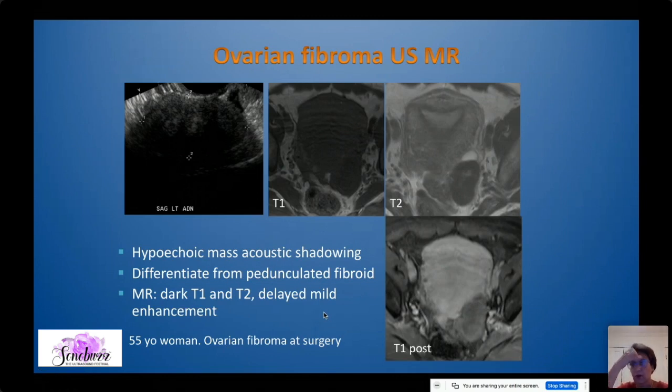But the thing is, in this particular case, we can tell the gynecologist it's likely to be an ovarian fibroma, and they may like to do laparoscopy, not an open laparotomy, but a less invasive surgery. So this is an interesting case.